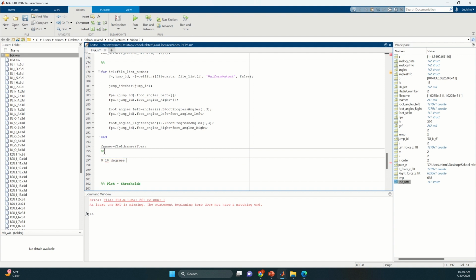Okay? And what that means is we want them to land at 0, but we're willing to accept the trial as long as it's 5 degrees extra in either direction, so toes in or toes out. And those two are expressed as negative angles for the toes out in plug-in gait, and for toes in it's positive angles. So pigeon-toed, anything pigeon-toed for foot progression angles will be deemed as a positive angle.